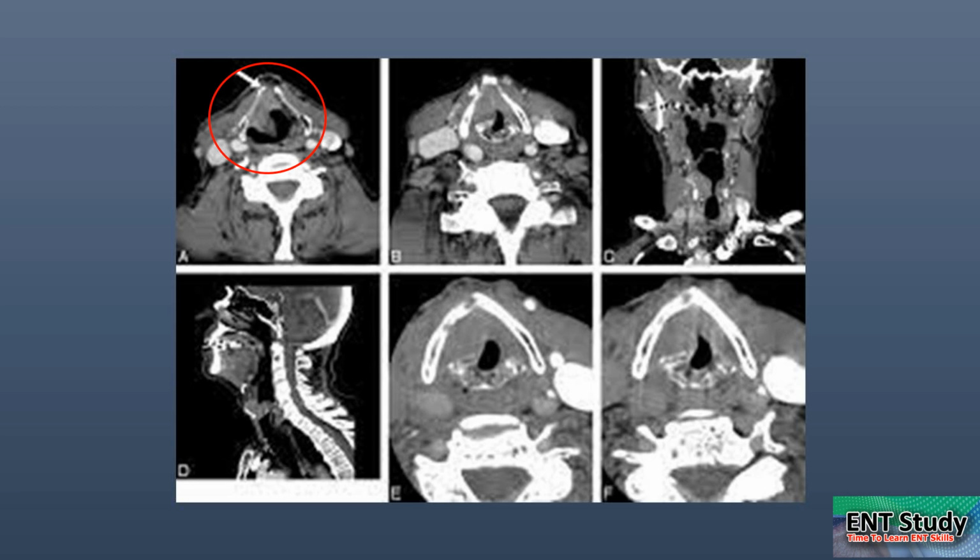Look here, crossed the midline, both sides, even posteriorly. Look at these spaces. Look at these erosions, look at this very intact cartilage and look at these areas of erosion, even from outside, meaning that this is escaping and eating it from outside as well.